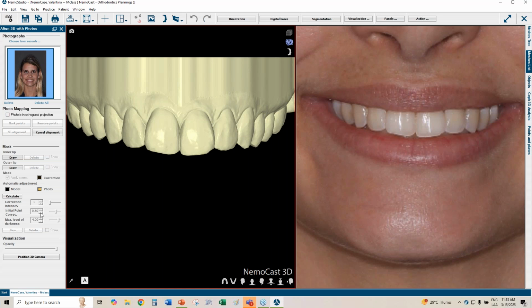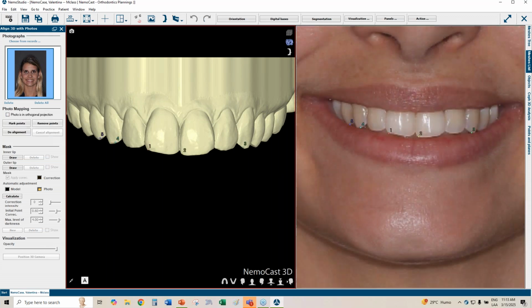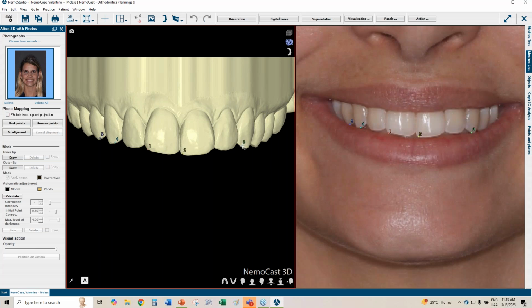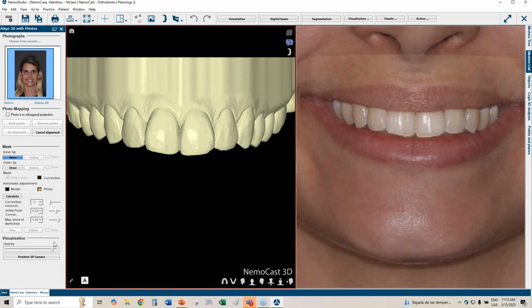In this particular case, as you can see, I have a little bit of a rotation. The outer contour of the teeth is not placed correctly, so I can always cancel it and try to do it a little bit more to our liking. So move a point around. If it worsens, then you can move it the other way around. Like that. And once we get a better fit, like in this case, we're already in a better position, okay? Then we can draw the inner lip contour.